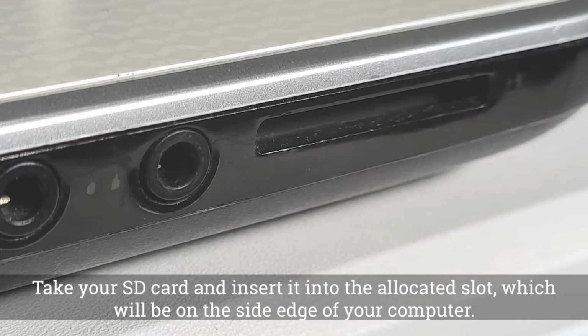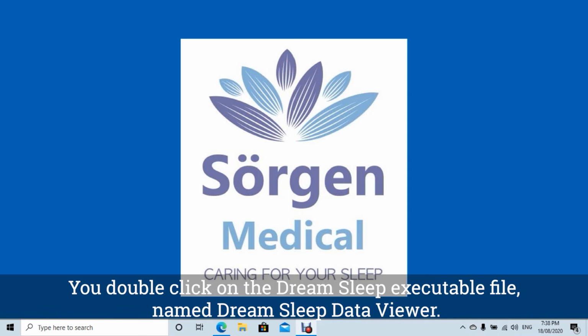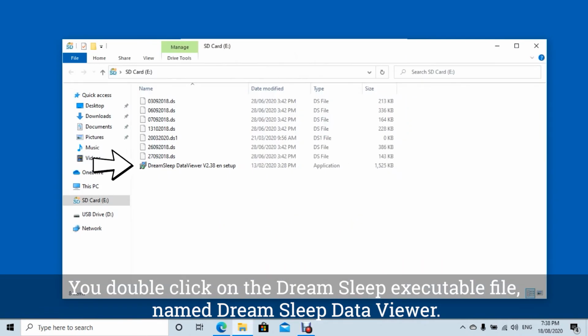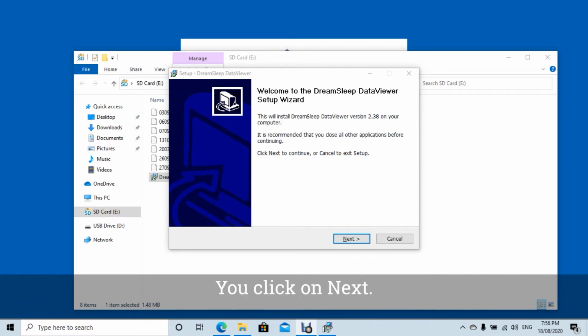Take your SD card and insert it into the allocated slot, which will be on the side edge of your computer. You double click on the Dream Sleep executable file named Dream Sleep Data Viewer. This then opens up into another window welcoming you to install the Data Viewer application. You click on Next.